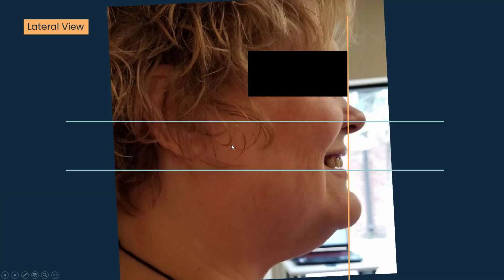So here is the lateral view. Again, I'm looking specifically here at the incisal edge. We've lined this up from the tragus of the ear to the ala of the nose. And then this is just a parallel line to that. But once again, it becomes evident that these canines are sticking down lower than the incisal edges. So I'm imagining I will probably have to lengthen the incisal edges some and then bring those posteriors from the canine back up to correct that occlusal plane. And so the starting point is to do the simulation. Now, this was the first one I did.